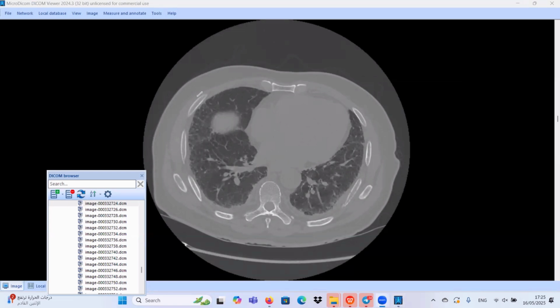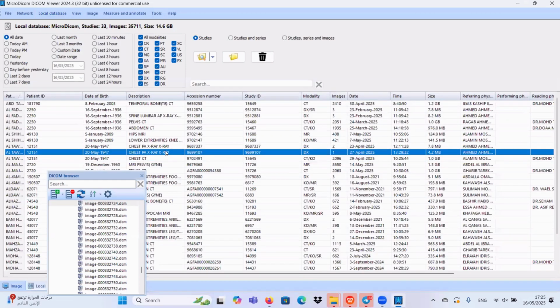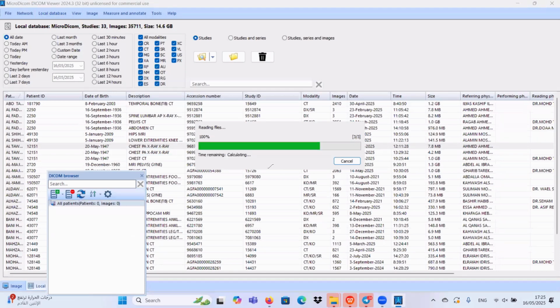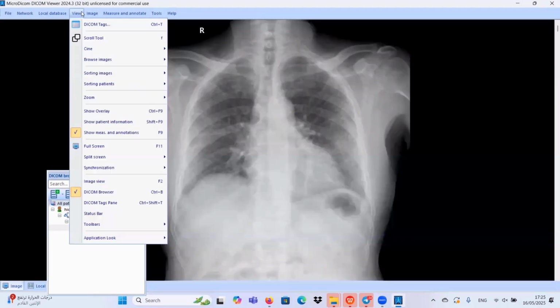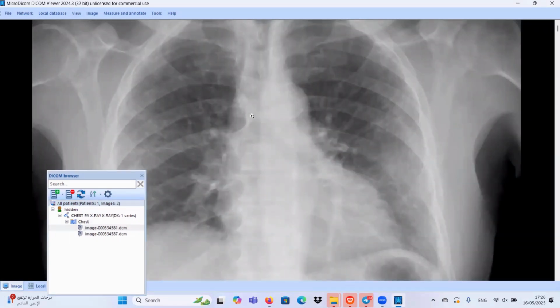You're right. The X-ray, I think if you review the X-ray again, it's very clear. If you go rib by rib, you will find this area. The cortex of this rib is ill-defined, not like the rib above. Look for the rib above. The cortex is very defined. Look here, the rib is ill-defined as compared to the contralateral side.